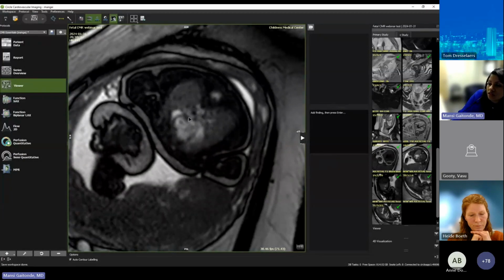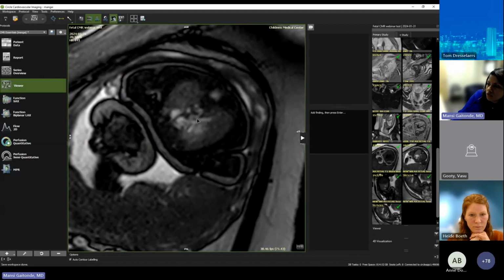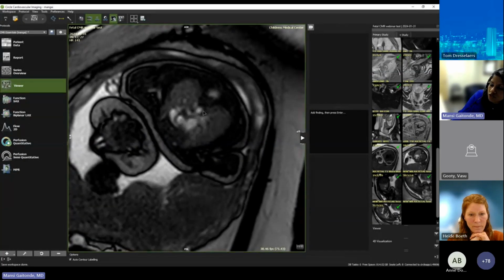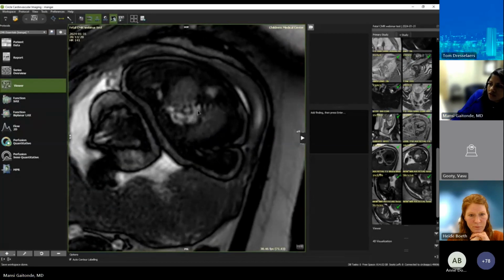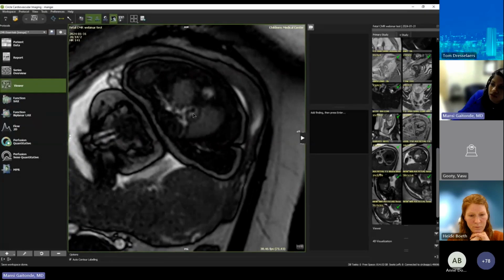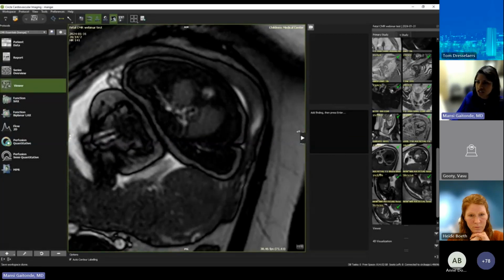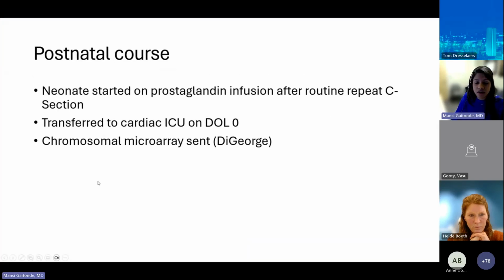The other question was, how is there an aortic arch present? So we're continuing to look to the back of the baby, the posterior part. We have a descending aorta here, trying to figure out if we can define a transverse arch located here. You see the SVC and an innominate vein. You have a ductal arch here. And if this is the aortic arch, we suspected that this was very small. And so a significant obstruction was suspected based on these pictures. That did end up changing our plan for the baby.